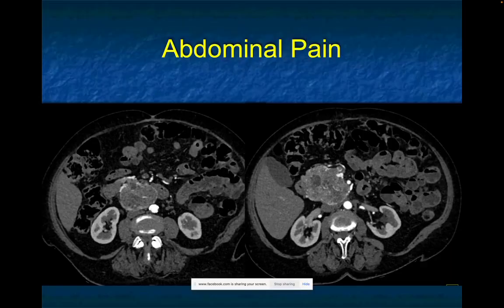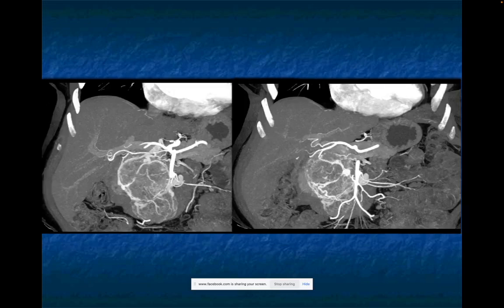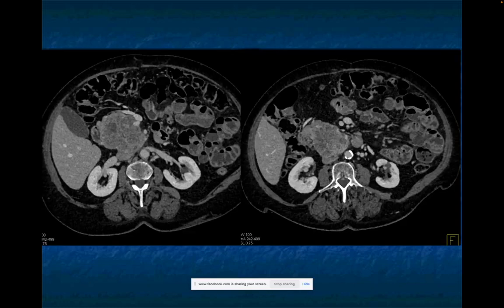Great case. Okay, let's move over to pancreas. Vascular lesion or somewhat vascular lesion in the head of the pancreas. Now, everyone is going to quickly go for a neuroendocrine tumor. When you start looking at the lesion, the vascularity is more in the periphery, and what you're seeing are really stretched vessels. And yes, I know I'm still going to think about a neuroendocrine tumor, but what you need to think about when you see stretched vessels and not distorted vessels, and by the way, there's a small GDA aneurysm or pseudoaneurysm, you've got to be thinking about an atypical appearance of a serous cystadenoma.